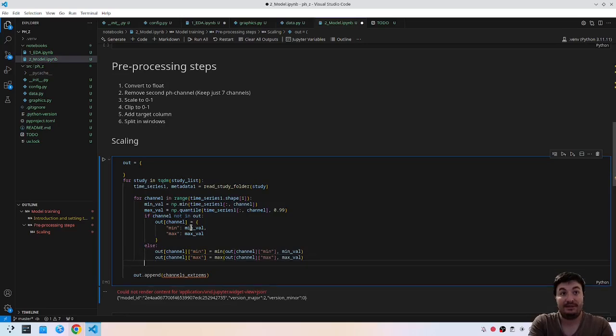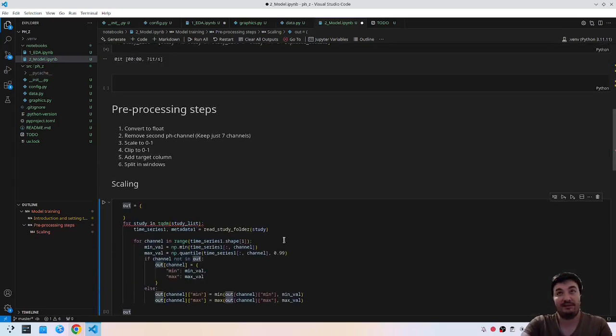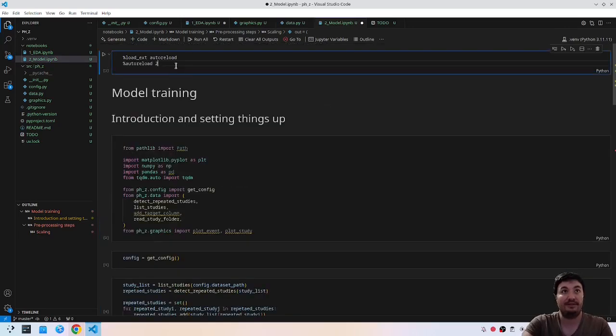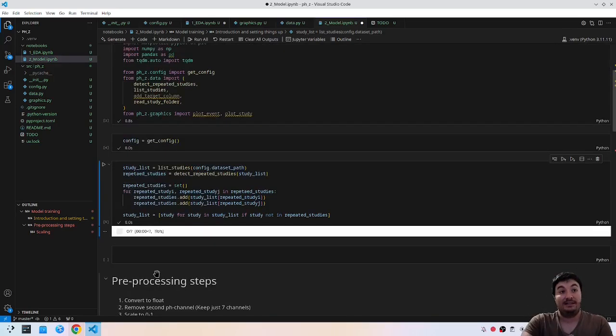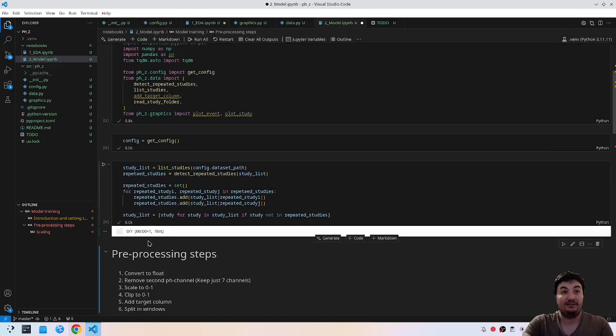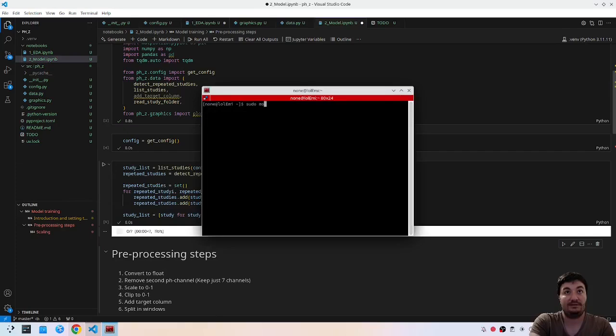But okay. So again we'll have something. Okay, I should import everything. And then maybe we can create a scikit-learn transformer. And oh, the dataset is not mounted probably. Let's see. Okay.